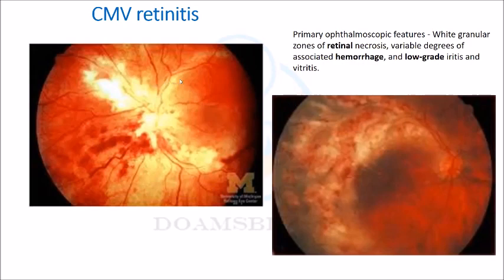Where is the copper wiring? Where is the arteriovenous nipping? Minimum one or two features should be there, right? You see the optic disc is blurred, so it may be papilledema also. But there should be other grade features also, grade 1, 2, 3. There is nothing, and no hard exudate is visible, only damaged retina visible as white patches. So it may be confusing with the hypertensive retina.